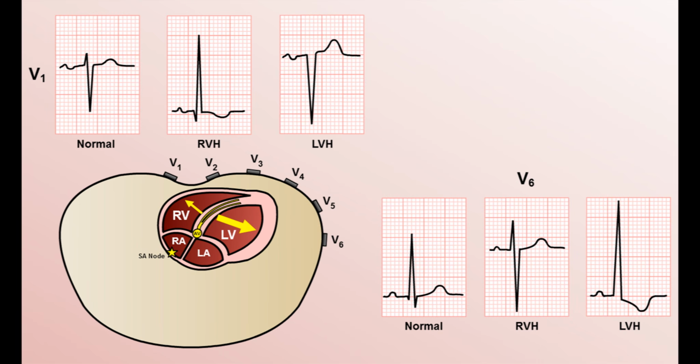One can summarize these findings by saying that in the precordial leads, RVH causes the QRS complex directionality to be the inverse of normal, while LVH causes the QRS amplitude to be more pronounced but in a normal direction. As leads 1 and AVL run in the same general direction as V6, often the same findings we see in V6 here in both RVH and LVH will be present in those limb leads as well. You may have noticed that the ST segment and T wave for some of these QRS complexes appear a little unusual, which brings us to the next topic.